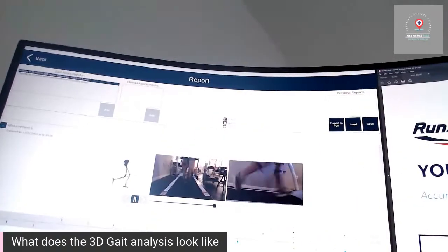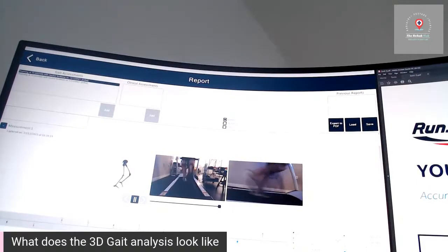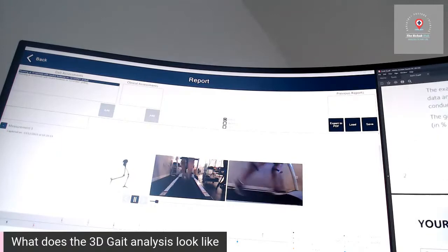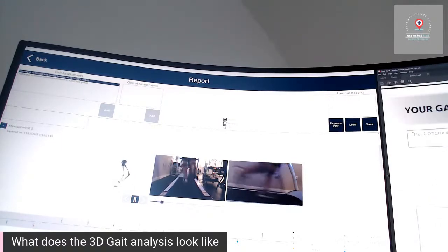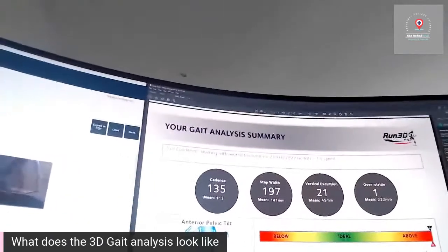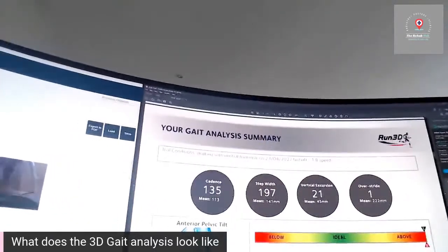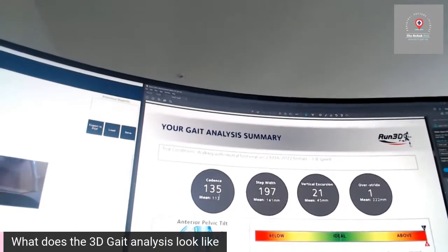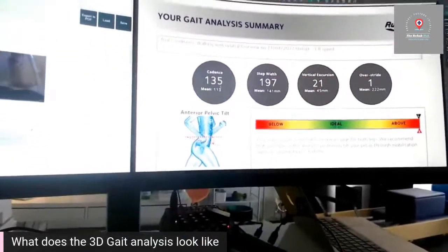Right, so I'll pull this up. So when the patient's in, they've come in for a reason. They've come in with pain, something's going on, they need help. They'll see this on one side, and then we'll usually pull up the results. So here's an example of what a report would look like. This is an actual report. You can't see any patient data from that, so we'll just let you have a wee look at what this looks like.